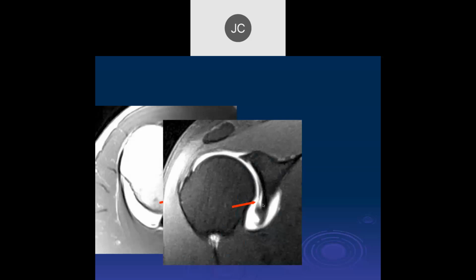Okay, so this is an axial T1 arthrogram. There might be a cartilage defect anteriorly. Okay, so right there. Now, the one thing here that we'll talk about, maybe we already have, is that the actual glenoid is abnormal here too. The posterior glenoid rim is very blunted. Yeah. The posterior labrum is very blunted. We'll talk about this when we get to the posterior labral tears. And there's kind of underdevelopment of the posterior glenoid rim. And then here on the coronal images, we can also see that delaminated tear of the articular cartilage.